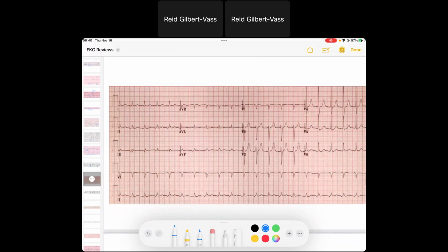So here we've got a tachycardia. It's regular. We've got a rate of 300, 150, 100, so maybe 120 beats per minute. So we've got a tachycardia. We've got some P waves. Those P waves, though, are maybe isoelectric in one, but they're negative in AVF. And so if they're negative in AVF, that means they're going up. So these P waves are traveling from down to up. And so to me, that tells me that these P waves are not coming from the sinus node. They're coming from an ectopic location, probably somewhere in the inferior portion of the atria, and the depolarization is spreading.